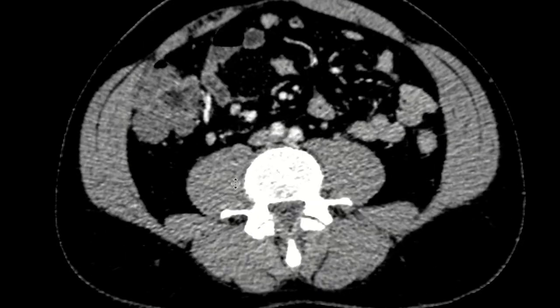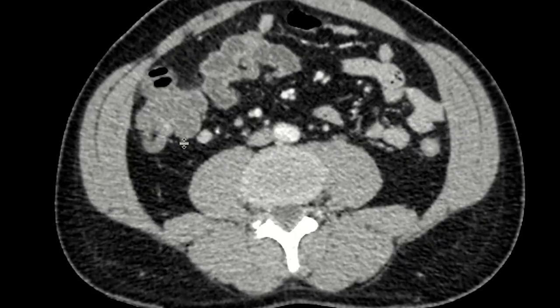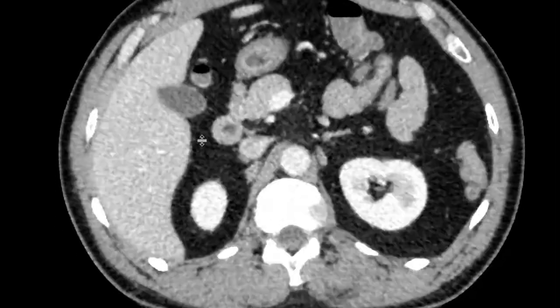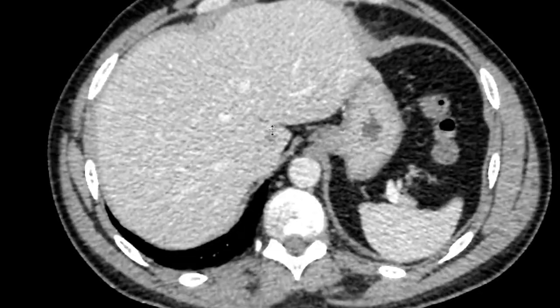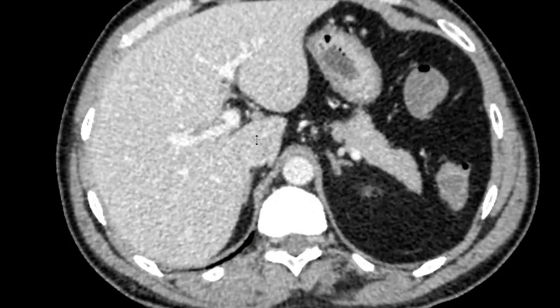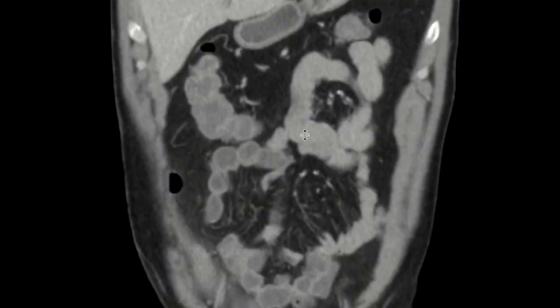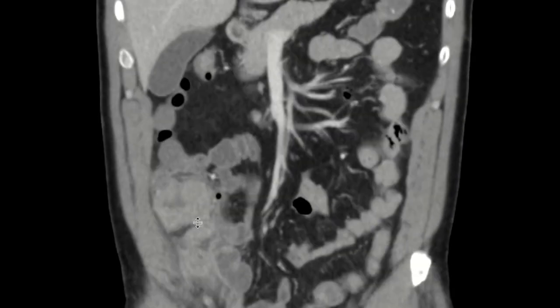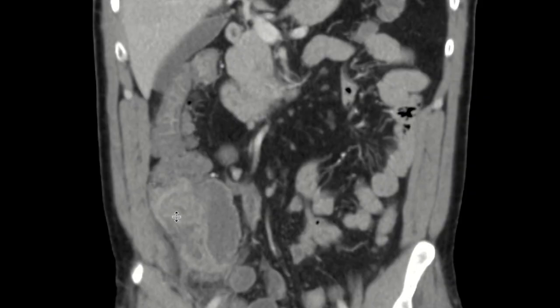And so this raises the concern for what could be inflammatory soft tissue, but you also worry about a cecal mass. So looking at this particular case, we can actually see that there are some lymph nodes here within the draining mesentery, and then coming back up to the liver, we can actually see that there's a small hypodense hepatic lesion. This patient ended up having cecal adenocarcinoma with metastases to the liver. Here we can see the same patient. Here you can see that mass within the base of the cecum a little better on the coronal view.